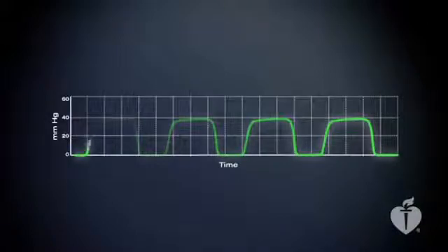Scientific studies have not yet validated waveform capnography as a method of confirming proper placement of supraglottic airways. However, effective ventilation through these airway devices should produce a capnography waveform. A normal carbon dioxide or CO2 waveform looks like this. The measurement of the amount of carbon dioxide can be shown as a waveform, where the carbon dioxide level goes up when we exhale and falls back to zero when we inhale.